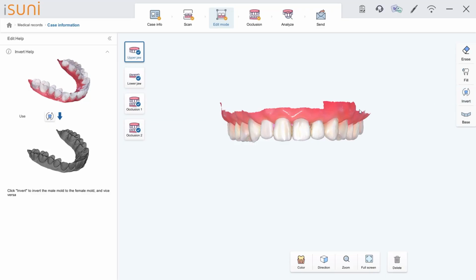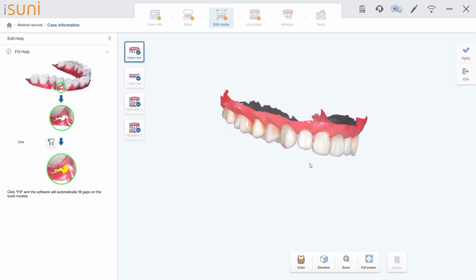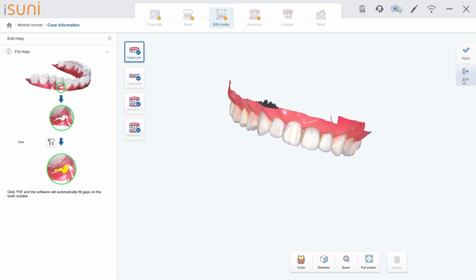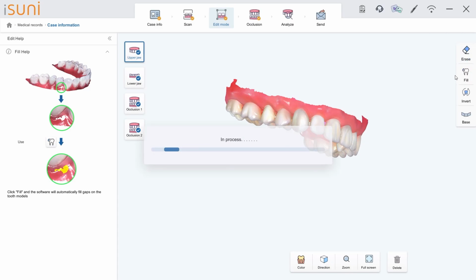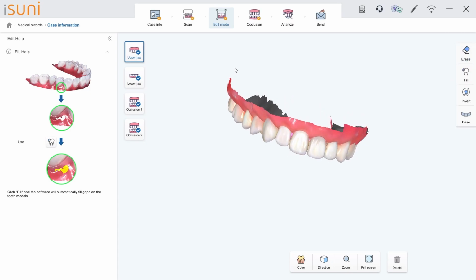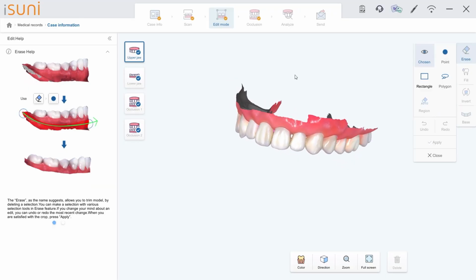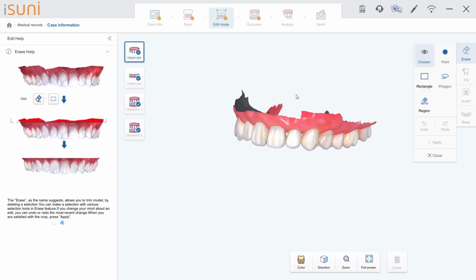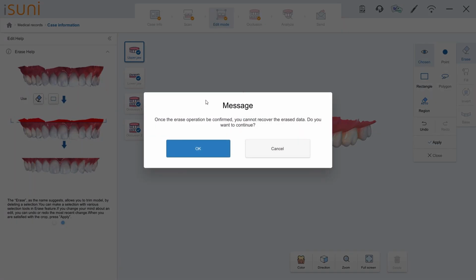And you also have the ability to fill over here, and you can try and get the AI to fill one more time if there's any area not filled. So you can see there's always a little graphic to help you out. Just gonna hit apply. And over here, you can also erase any feature if you took too much. See, I can erase a little bit over here. Not needed, but you can if you want to. Any unnecessary data.